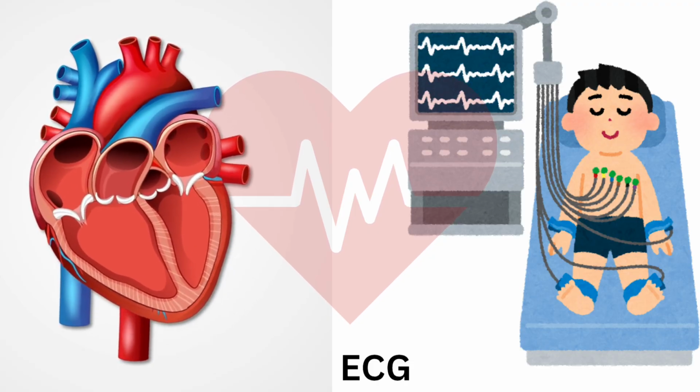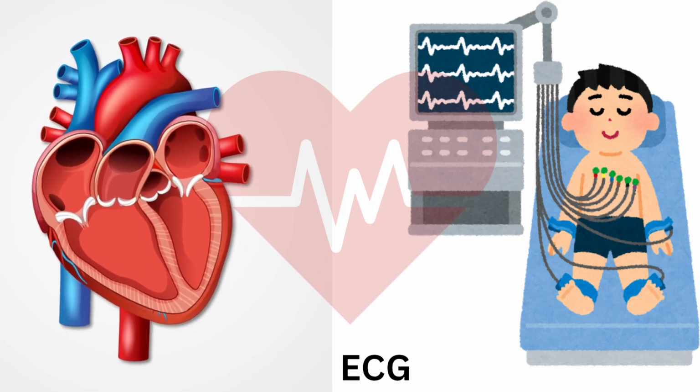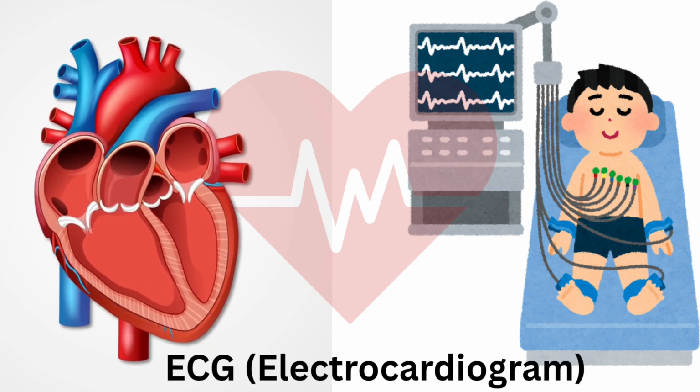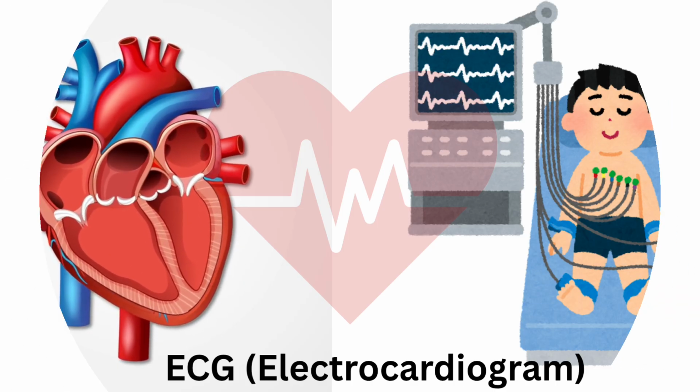ECGs can look scary at first, just a bunch of waves and spikes. But the truth is, you don't have to memorize everything. If you follow a simple step-by-step method, you can read any ECG confidently. In this video, I'll show you the 5 essential steps you need to know as a beginner.